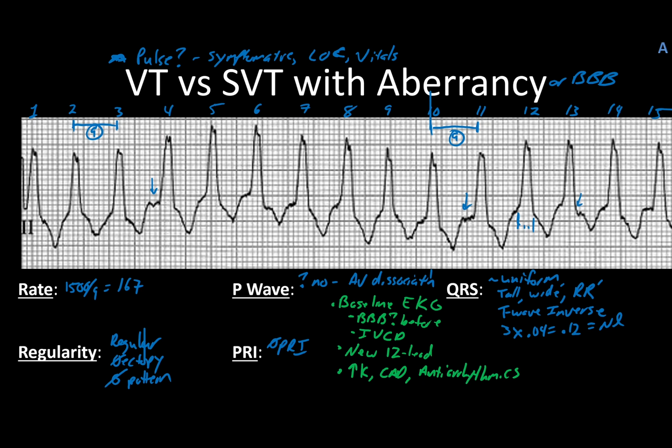I personally believe that in this case, this one's an SVT with aberrancy, if I remember correctly. But again, it'd be up for a real good debate as to what exactly is going on in this case.